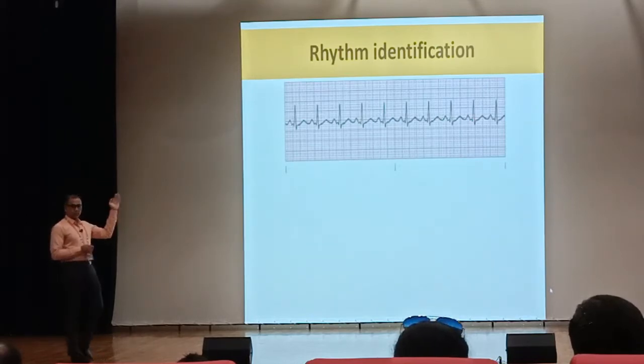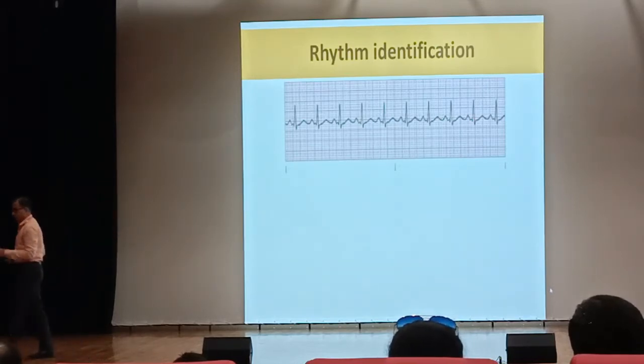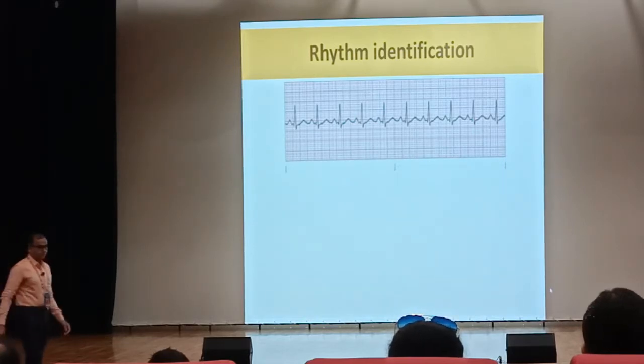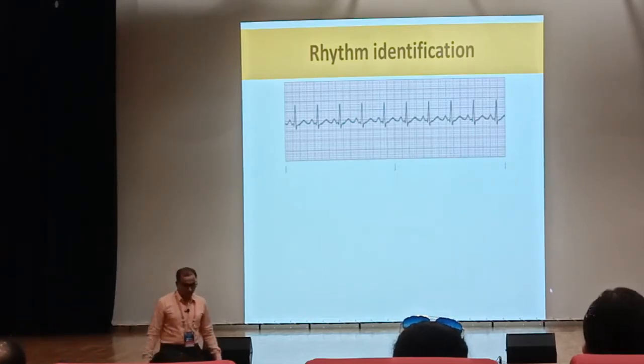Okay, if we go stepwise, one, we look at the heart rate. So how do we calculate the heart rate? What's the heart rate in this? You are right, your answer is absolutely correct. It's normal sinus rhythm. Can you take the mic so everybody can listen?